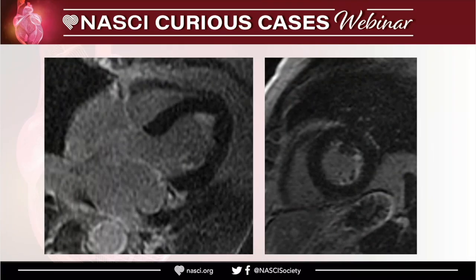Here again, this was not confined to any particular vascular territory, and the left heart cath had given us a more reassuring finding that there's no obstructive CAD. So seeing the pattern of ventricular apical thickening, a layering thrombus, enhancing endomyocardial tissue and normal myocardium, the diagnosis of EMF was suggested and path concurred with our findings.